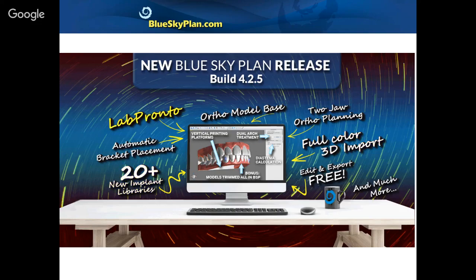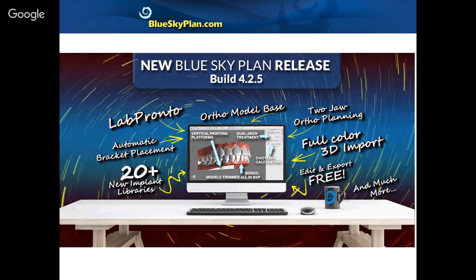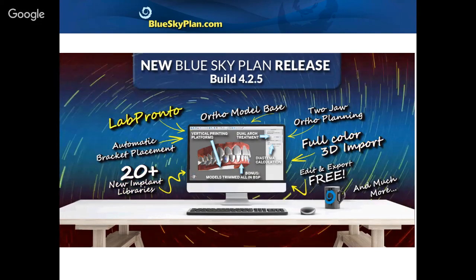Okay, the cutoff is when you create a surgical guide. Once you create a surgical guide and you're going to be exporting that surgical guide, then the normal fees apply. But all of the manipulation of the CTs and STLs could be done and exported at no cost.